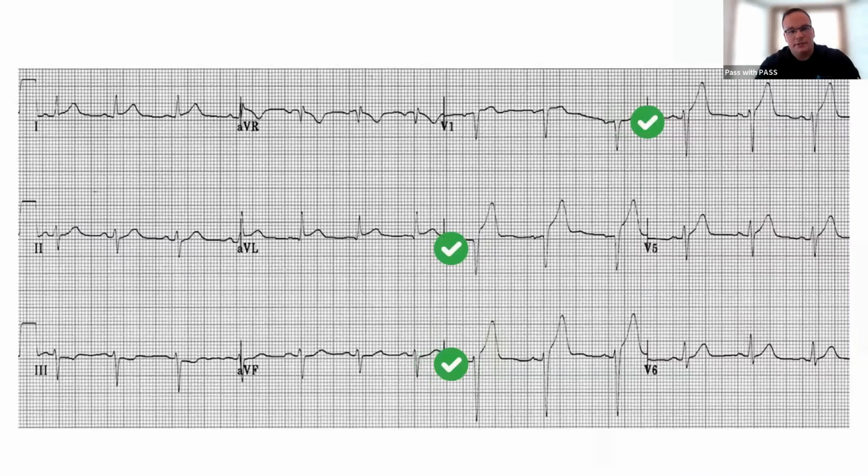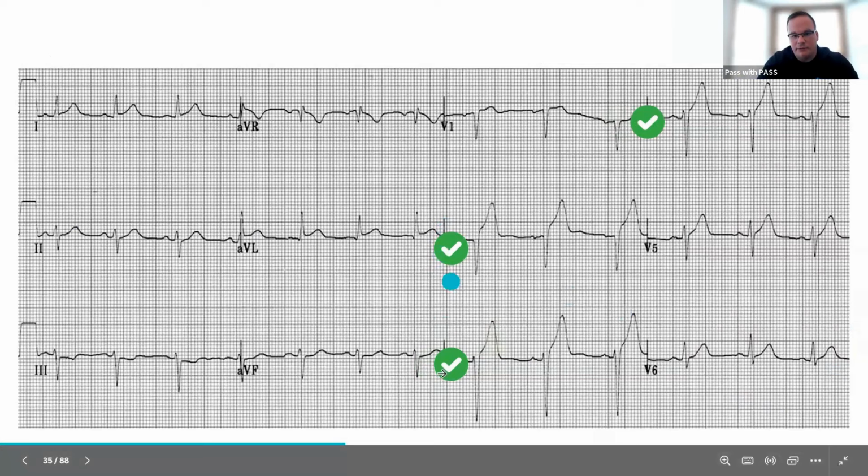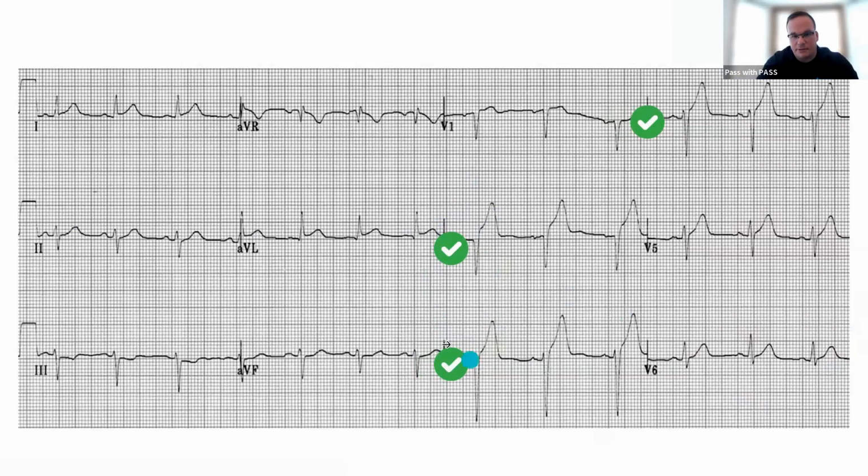So now let's look at this. We have ST segment elevation in V2, V3, V4. I think I'm just under 1 millimeter of elevation in V5. V1 looks a little funky, but I already have elevation in V2 and V3, so I really don't care about V1. It's not going to change anything for me. These 2 leads right here, V2 and V3, that's already enough to count that as an anteroseptal wall MI. V4 being thrown in there is just another lead showing an infarction pattern at that point.